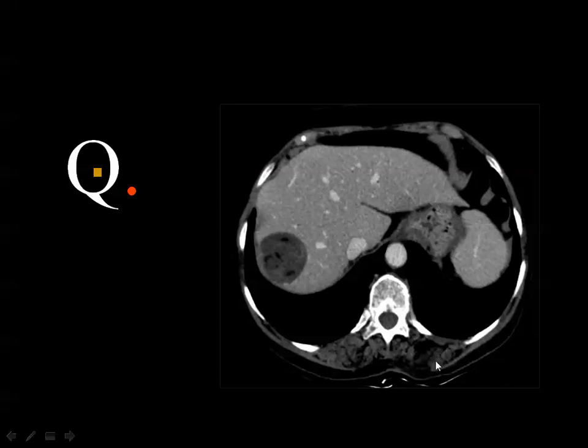Okay, this is a contrast enhanced CT scan of the abdomen after intravenous contrast injection, no oral contrast media, showing a focal lesion in the right hepatic lobe, segment number 7. And this lesion looks cystic or solid? Solid. Then what do you think about these hypodensities? Fat. Okay, the solid lesion containing fat. Adenoma, hepatic adenoma, and the adenoma is a hypervascular lesion, and this was hydatid cyst.